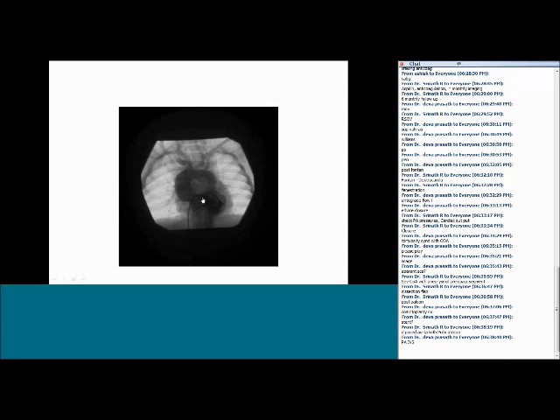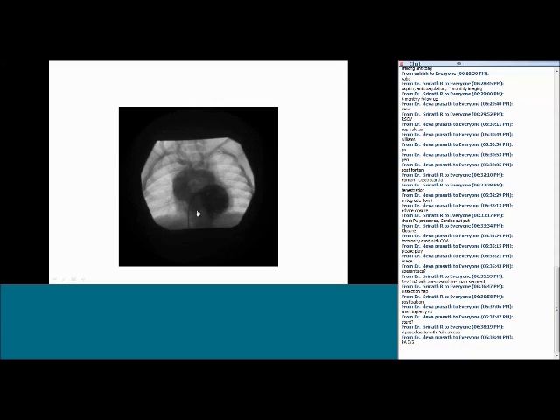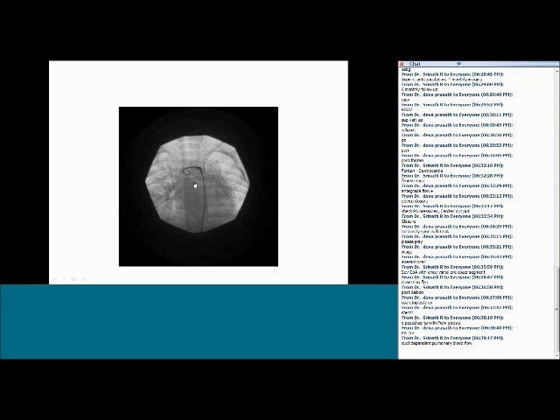No, see this angio doesn't look like an intact IVS. This looks more like a single ventricle. If you see the quality of this ventricle, there is a small septum in between here, and this looks more like a single ventricle with pulmonary atresia, isn't it? And it's a pulmonary atresia, and there is a severe stenosis of the left pulmonary artery. Ductal dependent pulmonary circulation is alright, but there is a severe stenosis of the left pulmonary artery at the site of ductus insertion.